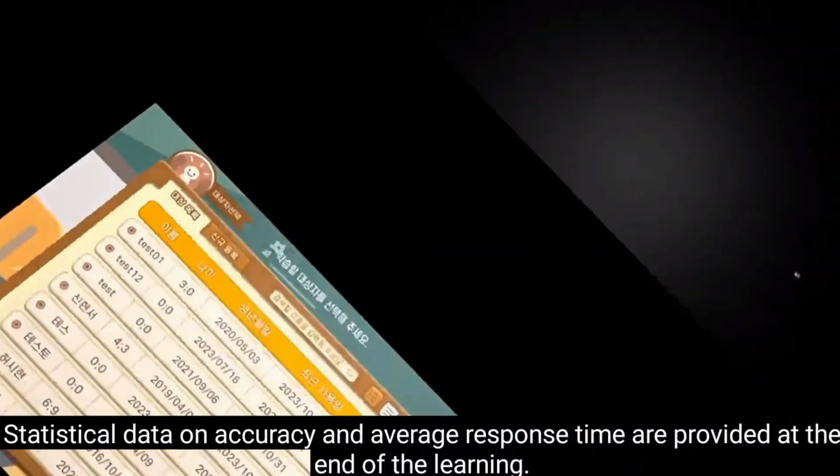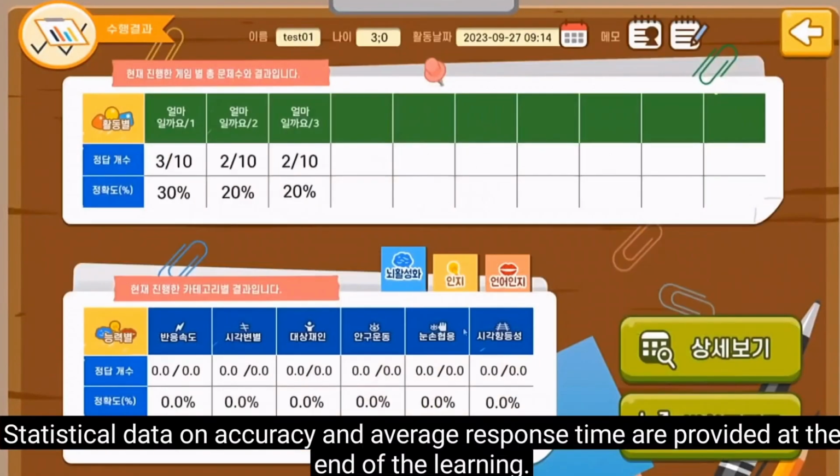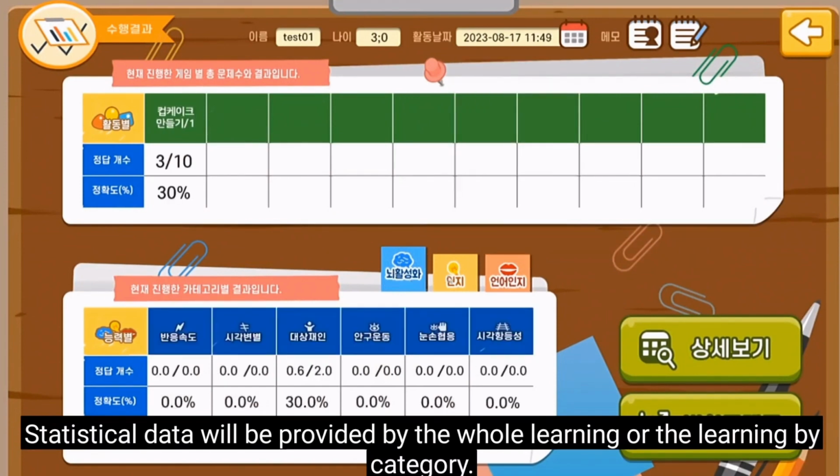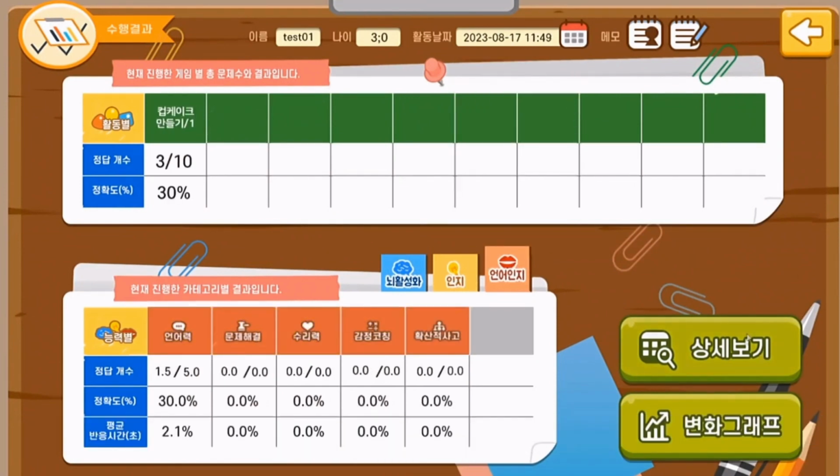Statistical data on accuracy and average response time are provided at the end of the learning. Statistical data will be provided by the whole learning or the learning by category.